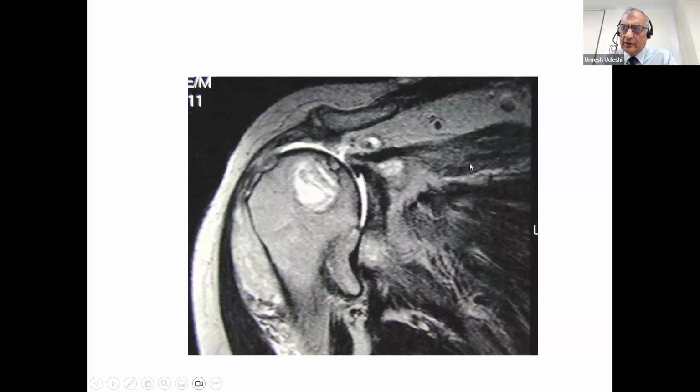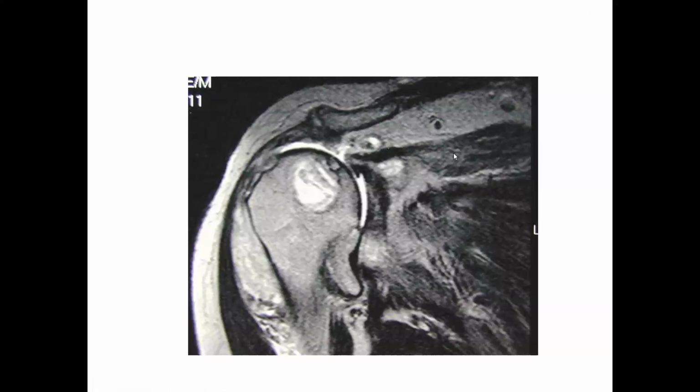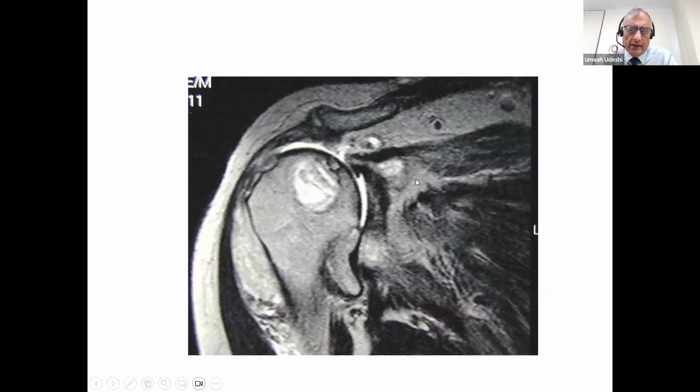Okay, very abnormal looking joint. And you can see the acromial space is very, very low, very, very small. There's joint fluid leaked out, so there's no tendon visible here. So there's a complete tear of the supraspinatus and probably infraspinatus as well. Here's the supraspinatus muscle belly. It should be filling this space underneath the clavicle. It isn't. It's a shriveled little thing. So there's at least 50% volume loss.